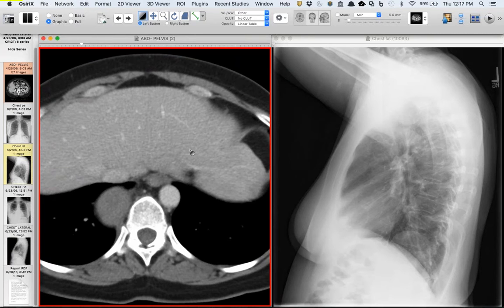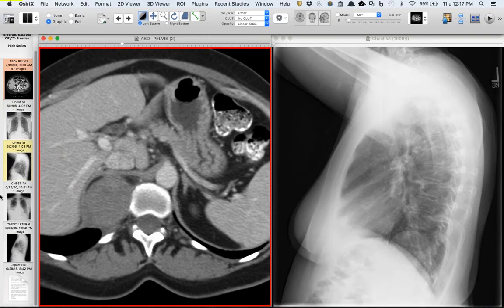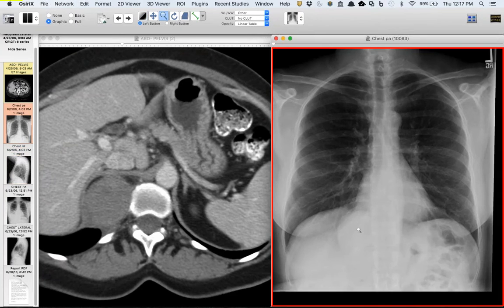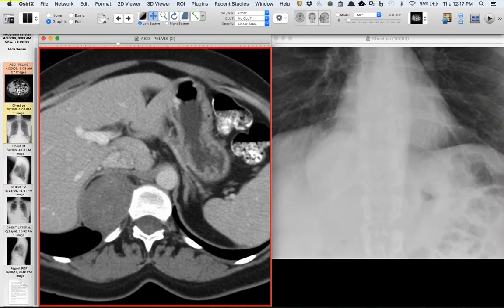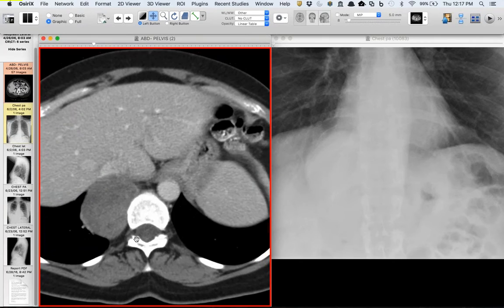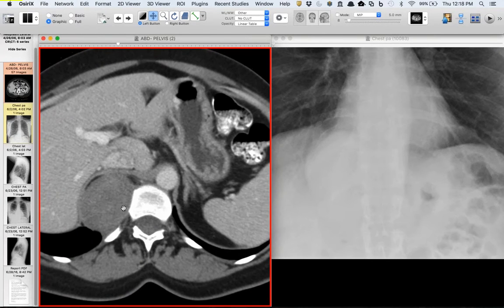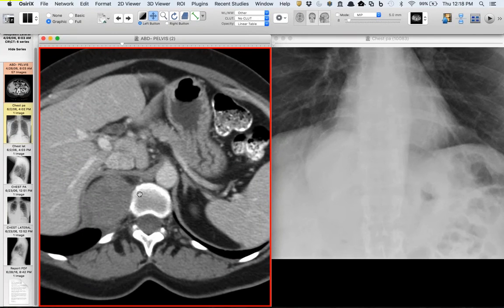Yeah, that's really interesting. And the intervertebral foramen was okay, right? Yeah. This is a pretty thick image. We didn't have coronals, but I don't think you can see any splaying of the ribs or enlargement of the intervertebral foramen. I looked. I didn't see anything actually arising from a nerve sheath in the chest. So I like the way the crus is draped over it. Yeah, right there. Mm-hmm. So, all right.